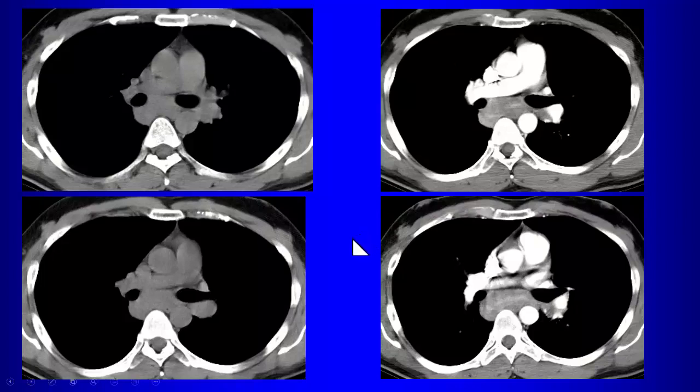Certainly a cause of that could be tuberculosis. There are other causes of lymphadenopathy like lymphoma. Not a good appearance for sarcoid because you don't really have symmetric hilar nodes. But what else could give you lymphadenopathy? Well, besides lymphoma, you can also have metastatic disease, right? So metastatic disease from other tumors could also give you lymphadenopathy.